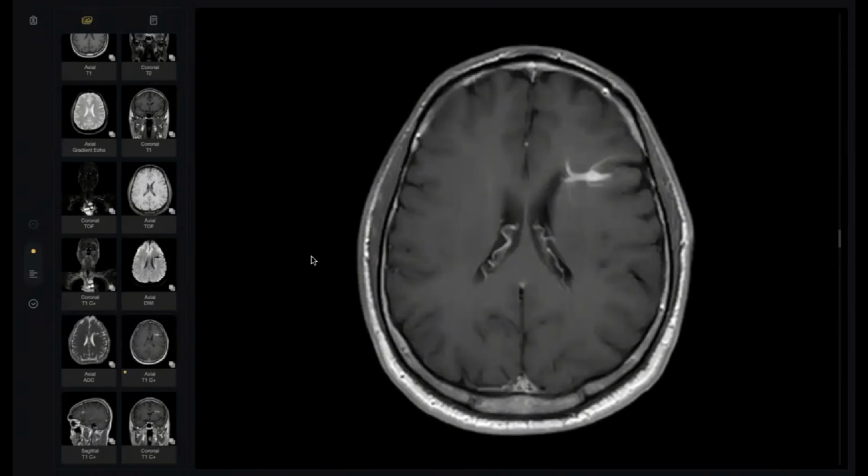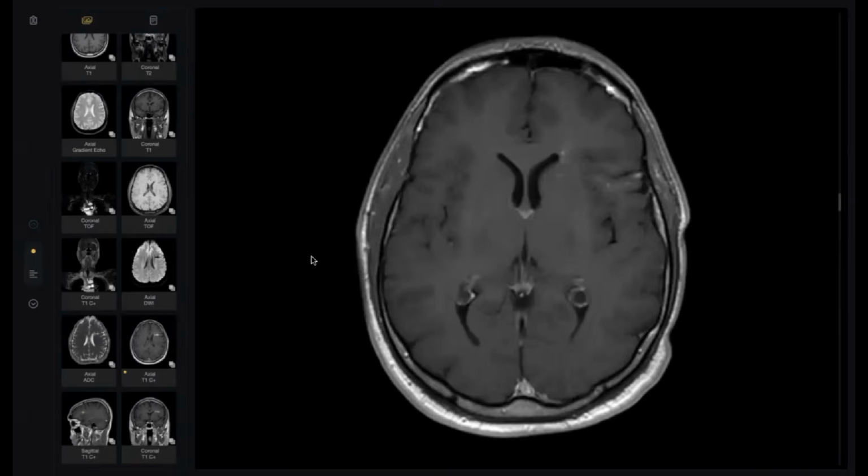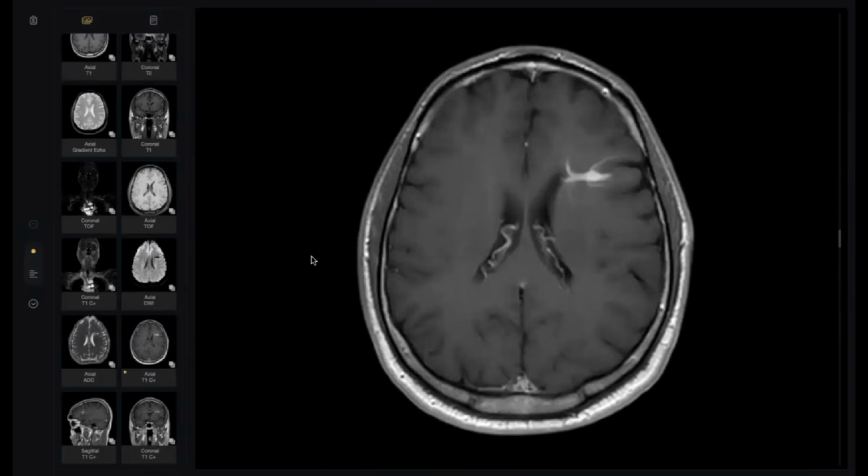Okay, this is post contrast. So, sir, I am seeing a linear hyperintense, actually enhancing structure extending from the left lateral ventricle reaching up to the cerebral hemisphere, cortical sulci. My concern for this patient is DVA, developmental venous anomaly.